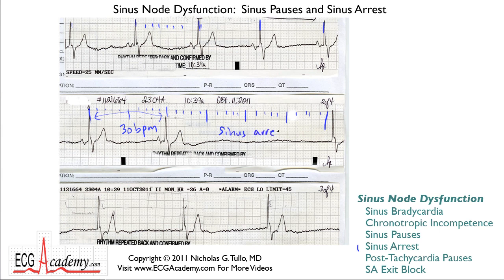Some people won't use that terminology. They'll be very vague about it. They'll talk about a 4.1 second pause. Either one would be correct in the normal vernacular, but strictly speaking, it could be referred to as sinus arrest.